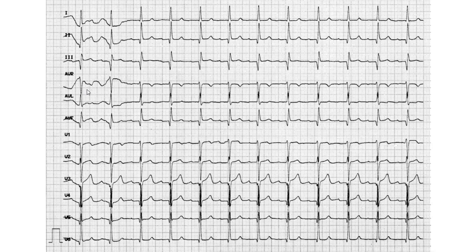So clearly the patient, either they were fidgeting with the electrodes, or an electrode was loose, or the patient was getting off his bed or getting onto his bed or whatever, because this whole part is an artifact. Okay, so let's just say that the ECG starts here, and we take our measurements from over here.